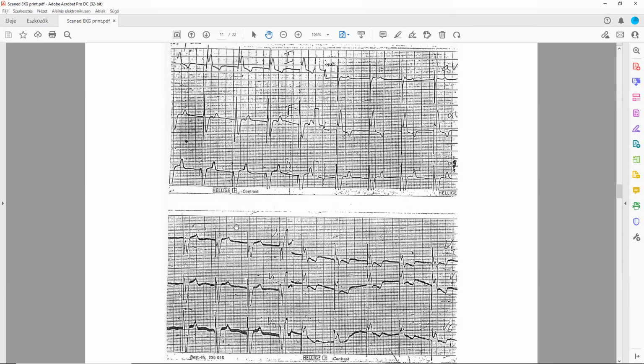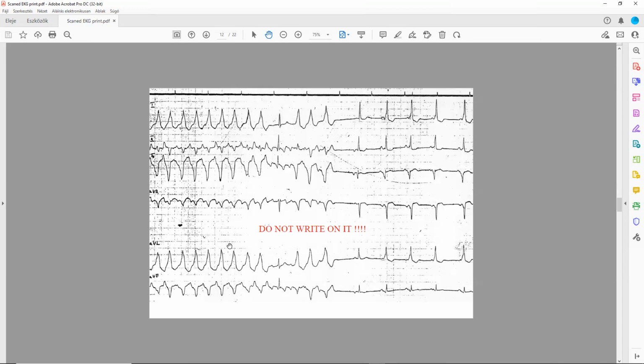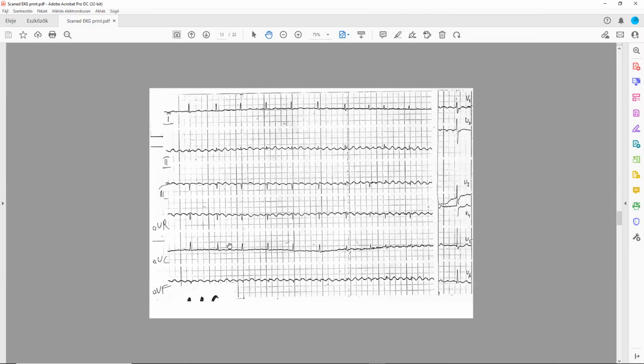If you had a pacemaker on the right side, then every impulse goes from right to left, so you have an electrical axis on the left side. If you had it on the left side, everything goes from left to right. What about the axis here? It's going from right to left, I think. Going from right to left, that's very good. So we do have a right ventricular implanted pacemaker. Very good. Thank you.